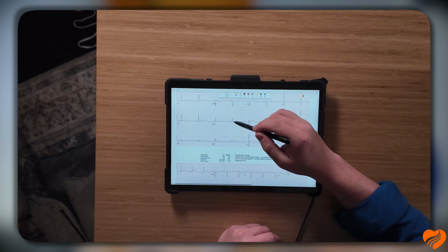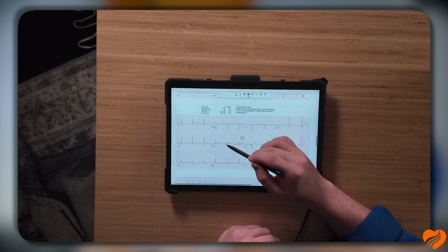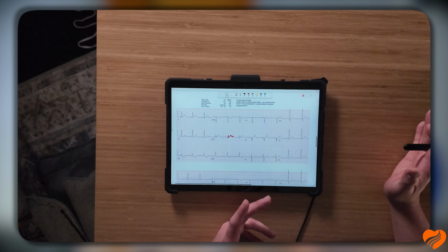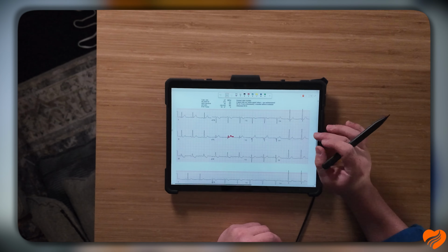Look at this beautiful QRS you had earlier. Okay, look at that very small T wave. Okay, that QRS kind of shrunk a little bit, right? And the T wave kind of grew as well. And now look, he's got T wave inversion, a little bit of depression in lead 3. So just another reason why you should be doing repeat 12 leads, okay?